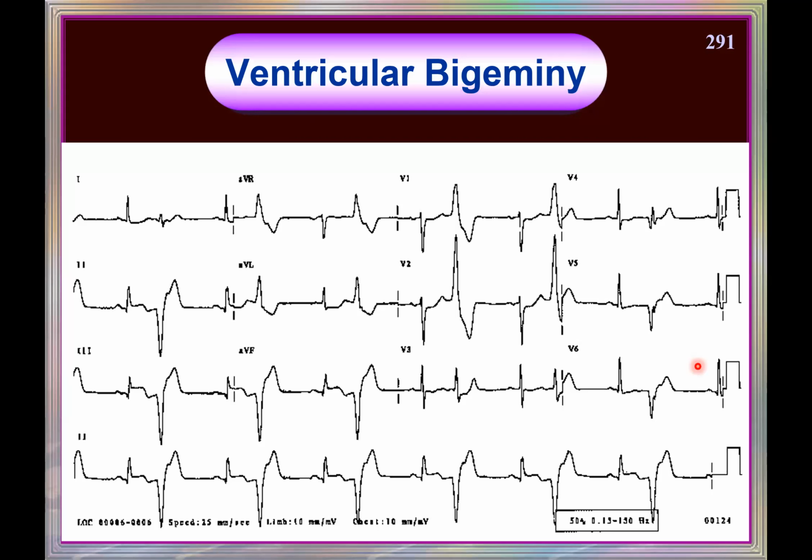Ventricular bigeminy. Ventricular bigeminy means there is an atrial, sinus nodal beat followed by a ventricular beat, and a supraventricular beat. So this is the supraventricular contraction from the SA node. This is the ventricular contraction. The narrow QRS is the one coming from above the ventricles, from the atria, from the SA node. This is the bizarre complex. Funny looking beat, FLB, is the ventricular one.